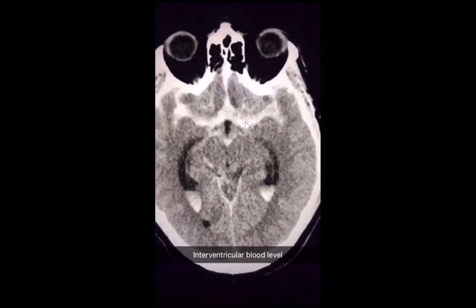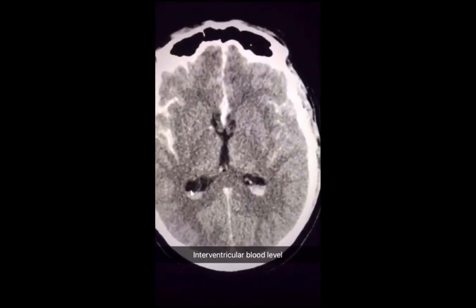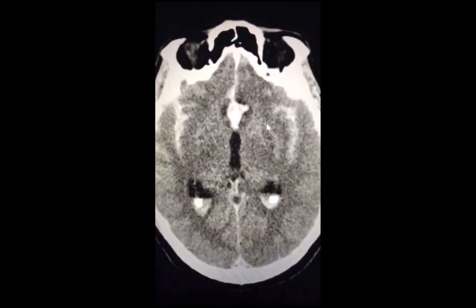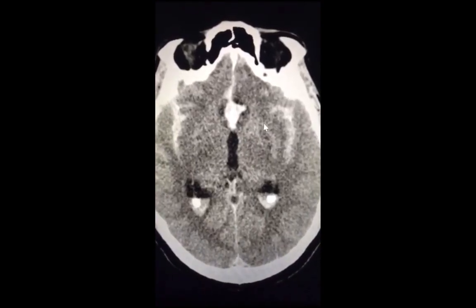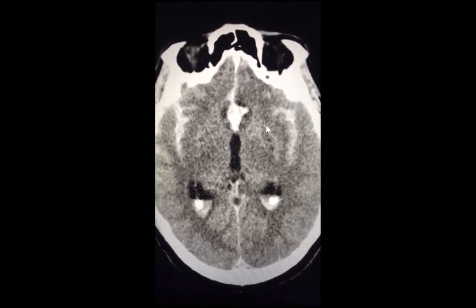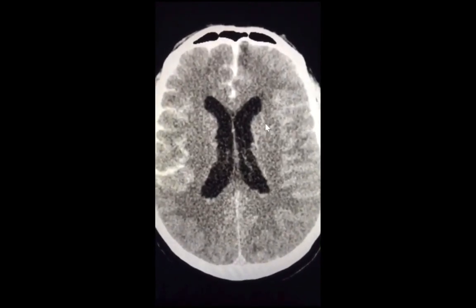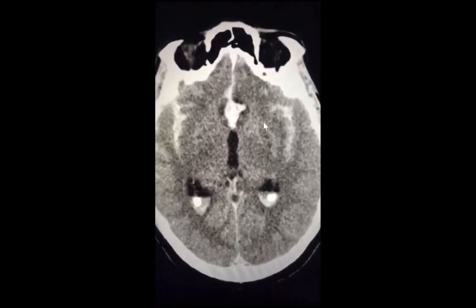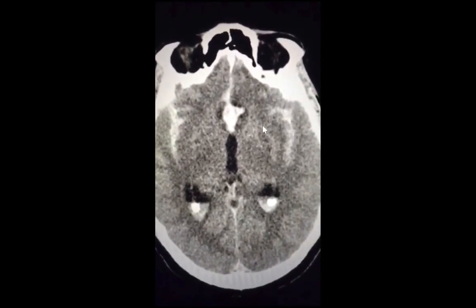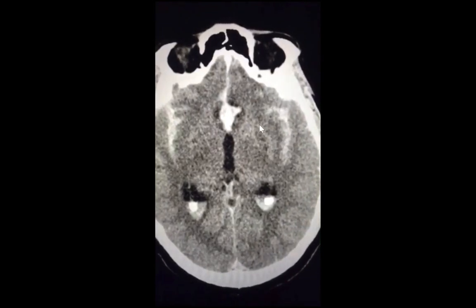A parameter of severity of subarachnoid hemorrhage includes involvement of the ventricles, and that's what you see here as a blood level. The reason I'm showing the case is to remember that subarachnoid hemorrhage is most commonly a result of aneurysm. Of course, hemorrhage of any sort anywhere in the body could be due to trauma. Subarachnoid hemorrhage could result from other non-traumatic causes as well, such as extension of hypertensive hemorrhage.